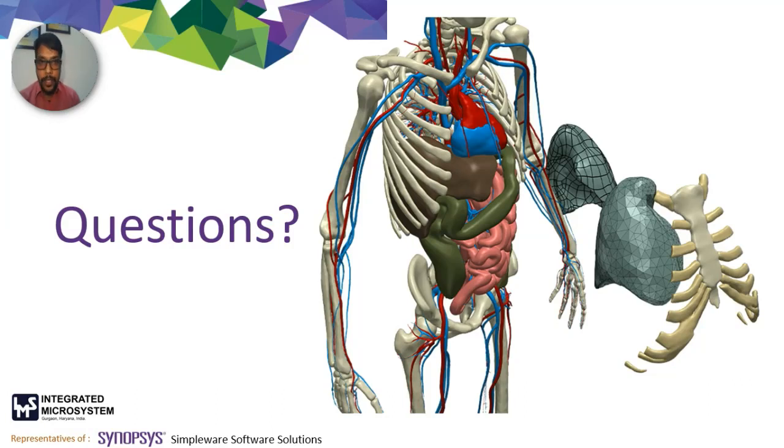And as Dr. Karim informed in his presentation, whatever you do with the mouse can be automated using scripting. So you can just drag and drop, and the operations that you have done, the processing that you have done, will be converted into a Python script, which can later be imported into the software, and you can run it in batches to work through various data sets.